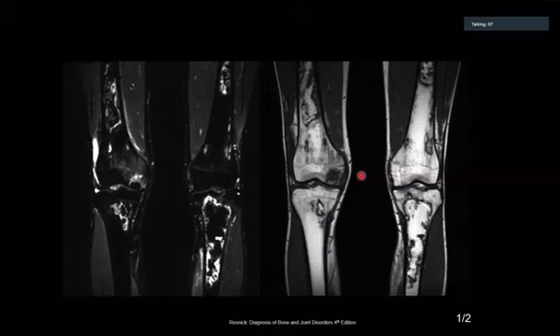There are also areas of abnormal signal in the left tibia, tibial metadiaphysis, with serpiginous shadowing. I'm just wondering if these are multiple areas of bone infarct. In fact, in the distal femur as well, bilateral distal femur, bilateral proximal tibias. So bilateral multiple bone infarcts are my provisional diagnosis here. There's a bit of knee effusion as well on the right side, especially.